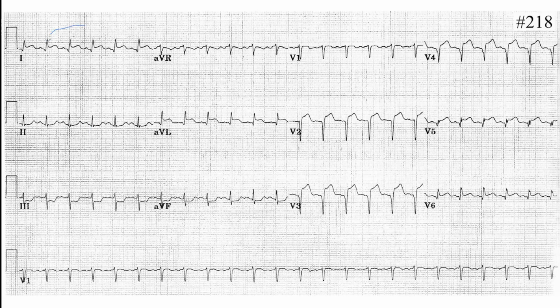Axis. What about the axis? You have to calculate the axis.